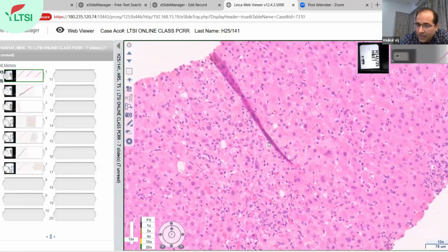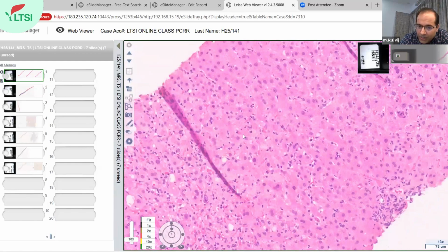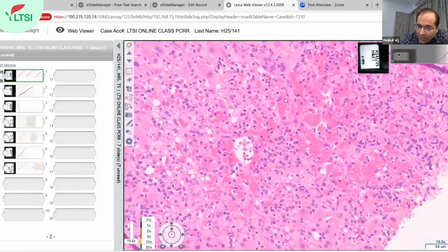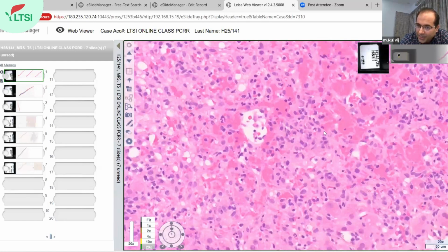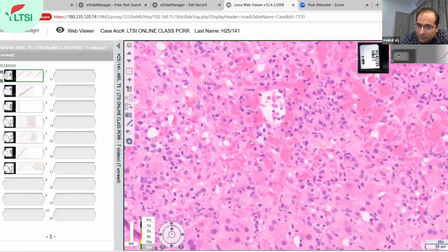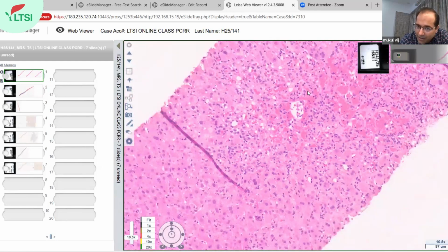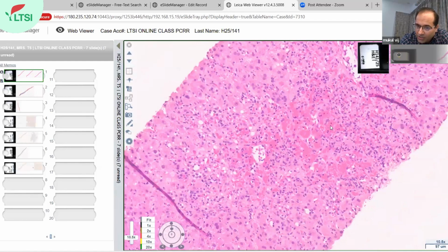There is a lot of necrosis again in this central lobule also. You can see the pericentral zone. This is the central vein. This is congestion here, and you can see these clusters of plasma cells with quite a bit of necrosis. This is confluent necrosis, severe activity in the biopsy. This is all hepatocyte loss.